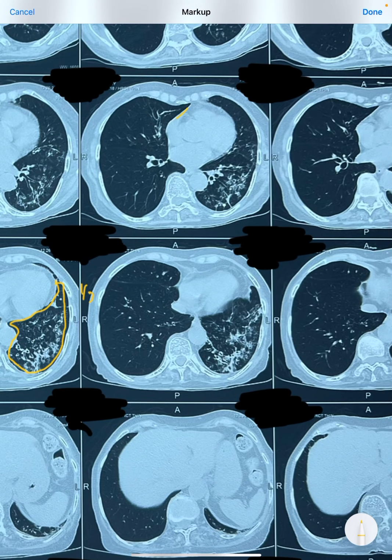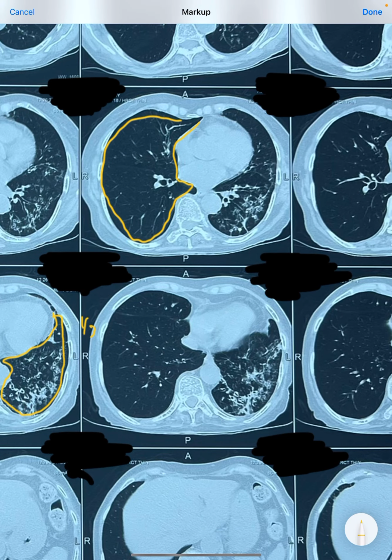See it here, on the right side the lung appears very normal because the bronchovascular markings are pretty good. There is no particular lesion and there are very fine bronchovascular markings going up to the periphery. But on the left side, see, there is markedly reduced lung volume. The volume is much less, almost around half the lung of the right.